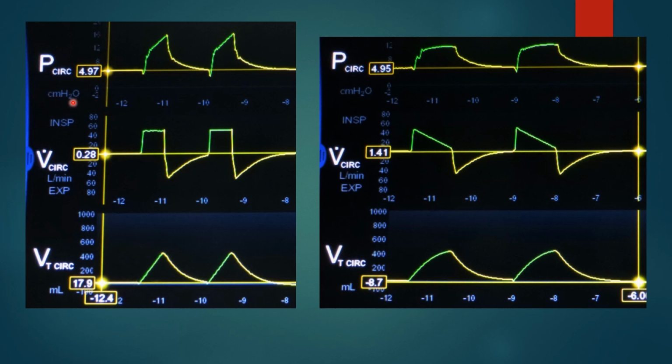The shape of the pressure waveform is determined mostly by the flow delivering that breath, or how that breath is being delivered. And in this example right here, the flow is constant. So this is volume control. We're controlling the volume, and so we have a constant flow all during inspiration. And when we have constant flow, then the pressure is not going to be constant. It's going to climb all during inspiration till the end of inspiration, and the patient exhales back down.